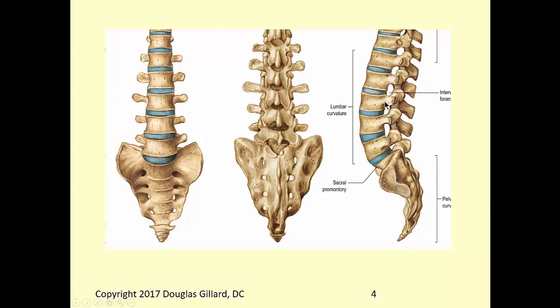If this was an X-ray anyway, I mean this would probably be the left one. If it was X-ray, remember X-ray radiographs run these over like with a steamroller and flatten them out so you can't tell. What's this thing right here? Looks like an ear. Well, this is half of the sacroiliac joint. That's your auricular surface of the sacrum.